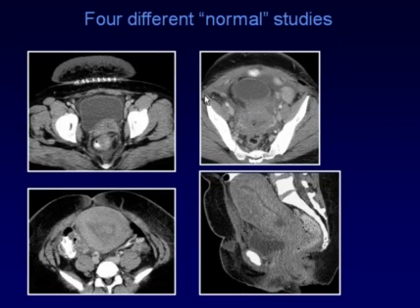These are images from 4 different patients who have essentially normal studies. What might look grossly abnormal in other patients is really within the spectrum of normal after a cesarean section. In case number 1, you can actually see the sutures from the incision of the cesarean section with some overlying skin thickening.